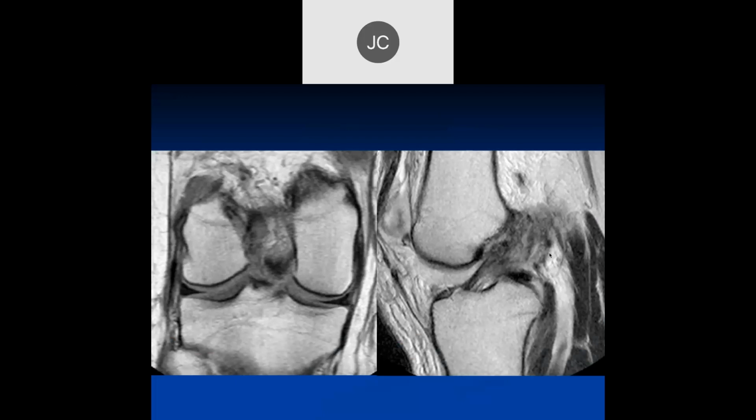This one looks to me like a proximal ACL tear. Yeah, well, this is actually hardware here. This is another proximal repair of a native ACL, and that's a suture anchor placement tied in, and it looks like it's pretty tight. And this patient's knee was stable after this proximal repair, so that's another ACL repair.